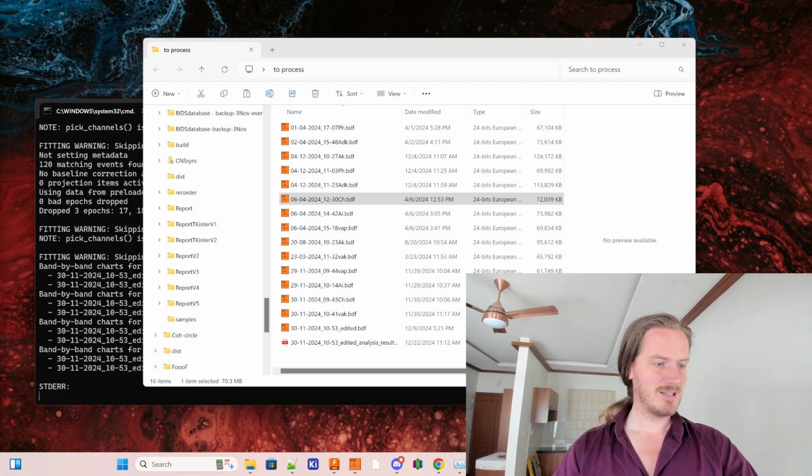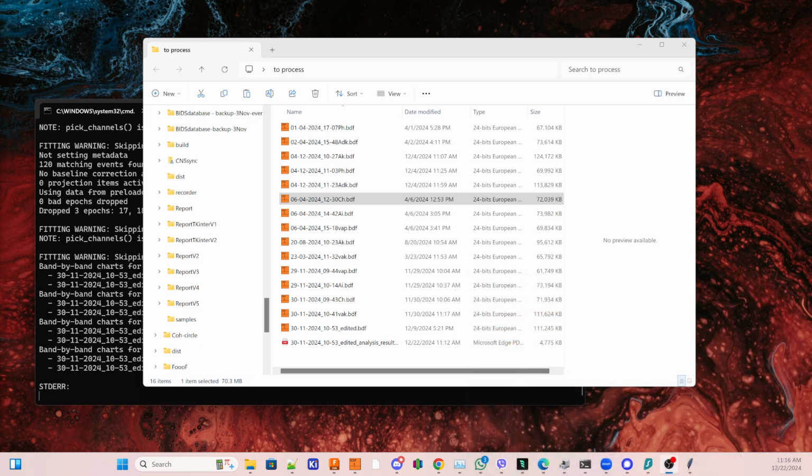All right, let's get started. Oh, one more very important thing. To do this, I most strongly recommend using a scroll wheel mouse. And that will become very obvious in a moment why. Like, do not do this on your trackpad on your laptop. Just get a mouse with a scroll wheel. You'll save so much time.